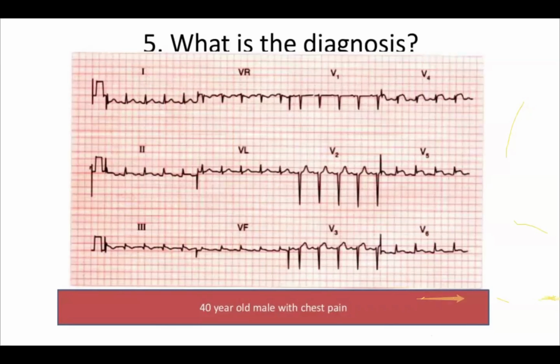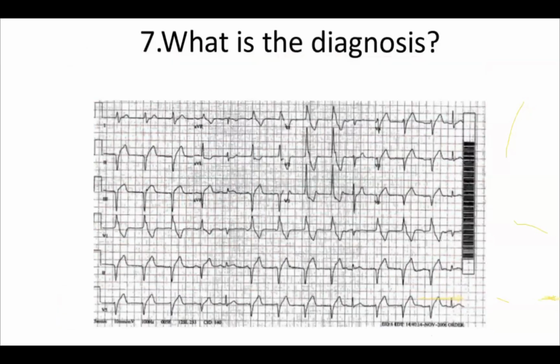Okay. So what is this ECG? Anyone can comment. I will give a few seconds. Trifascicular block. Trifascicular block. Any other takers?